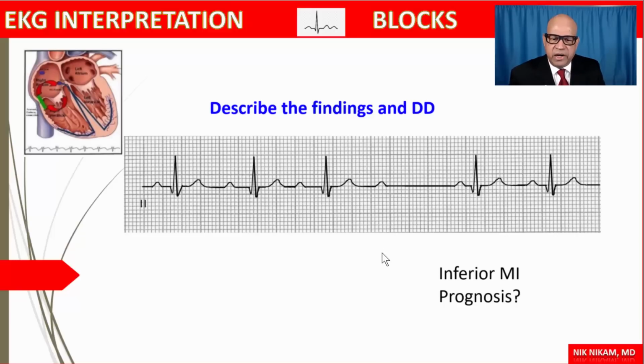There are a lot of features that we need to recognize in diagnosing Wenckebach, because as soon as we see it from a distance, we should be able to think about this as one of the presentations. First of all, grouping of heartbeats with pauses. That should signal to your mind that you may be dealing with Wenckebach. This may also be a premature atrial beat that is non-conducted. How do we differentiate between a premature atrial beat and a dropped P in a sinus rhythm?